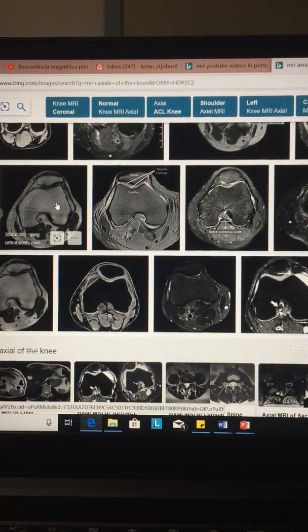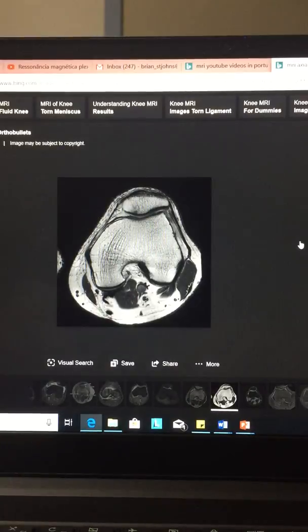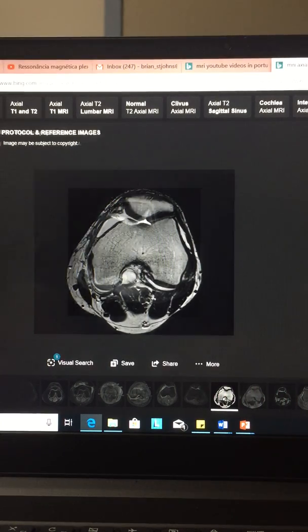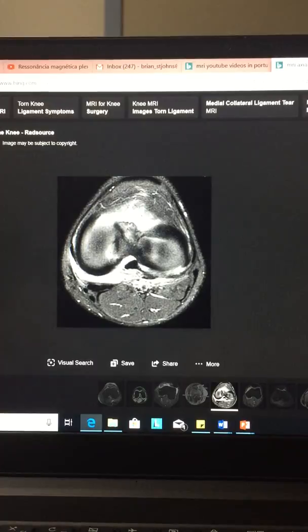Right, but you have to also look at these lateral condyles, because how one knee looks in regards to another is the difference of whether that is the right knee or the left knee. Okay, because they're going to be opposite each other, okay? The lateral one on that is right there. Over here, the lateral one is over here. Okay?